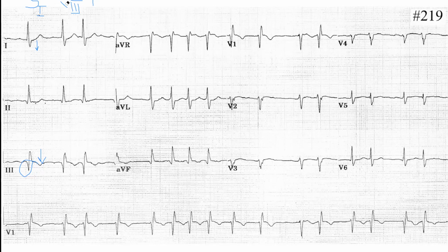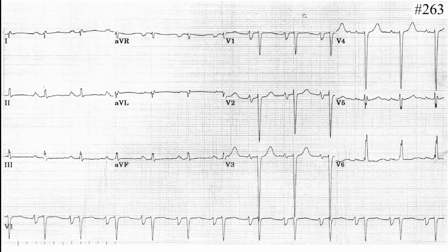About 20% of the cases when the patient has embolism of the pulmonary artery, they do have a sign on ECG, and that one is S1 Q3 T3, because we do have an acute stretch of the right ventricle, and that causes the right bundle branch block and the atrial fibrillation. Okay, good.